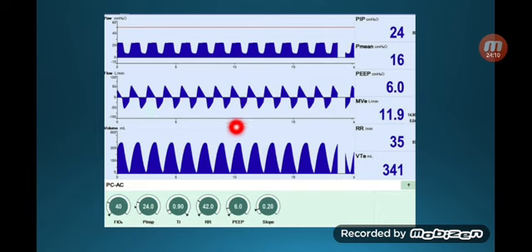What is wrong with this patient? What do we need to adjust with the ventilation here? Yes, what's happening here is we've got autopeep, because the expiratory limb on the flow curve doesn't go back in a nice way. The I time looks fine. So what can we do to fix it? Basically get the rate down.